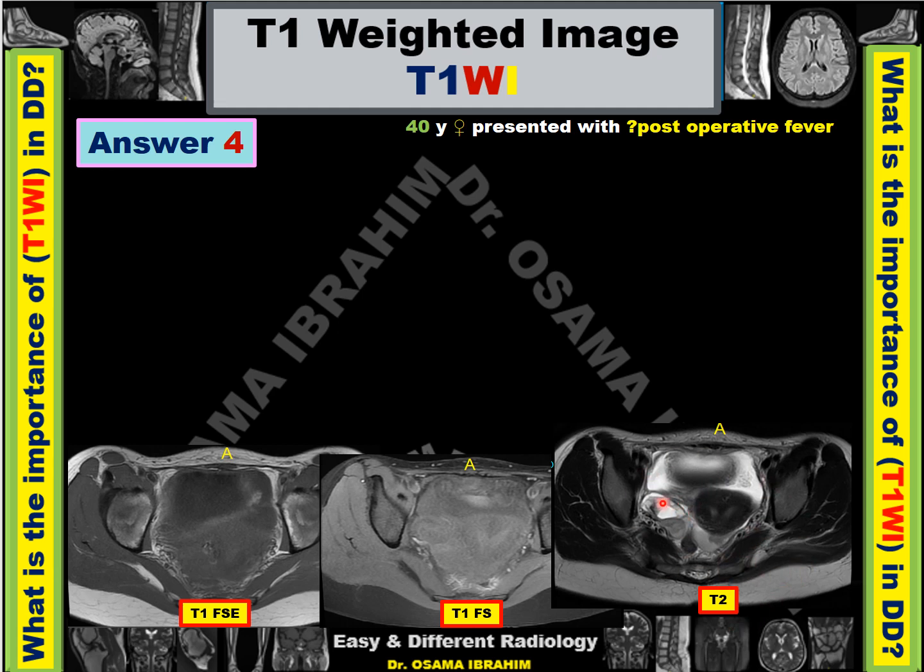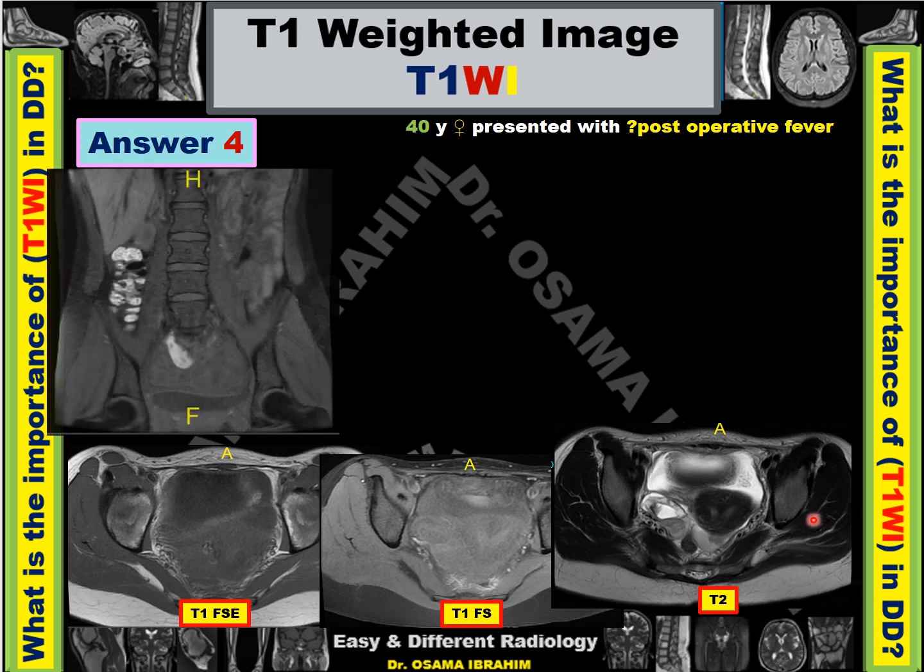The T2 shows there are cystic lesions in the right ovary, and also heterogeneous signals surrounding the ovary, and a longitudinal tortuous high signal posterior to the uterus and inseparable from the right adnexa. And this sequence is T1 fat suppression, because the subcutaneous fat is suppressed, however in the coronal position, and these high signals are due to oral contrast administration to the patient.